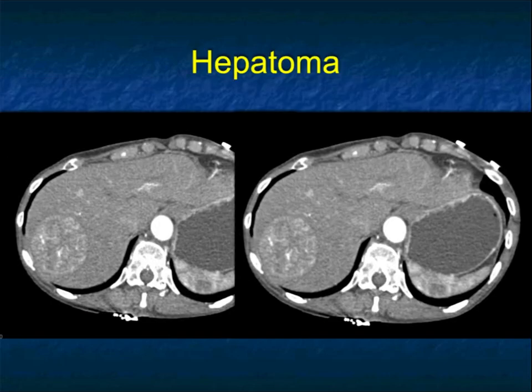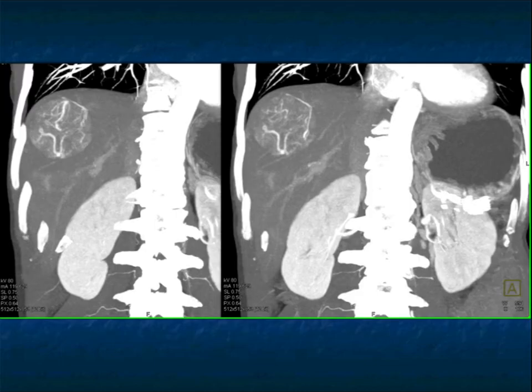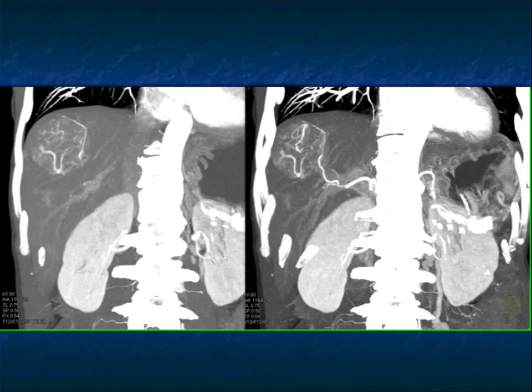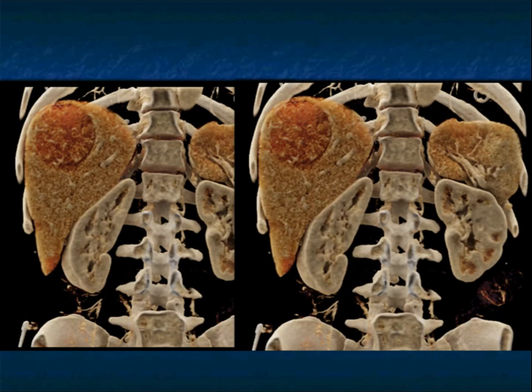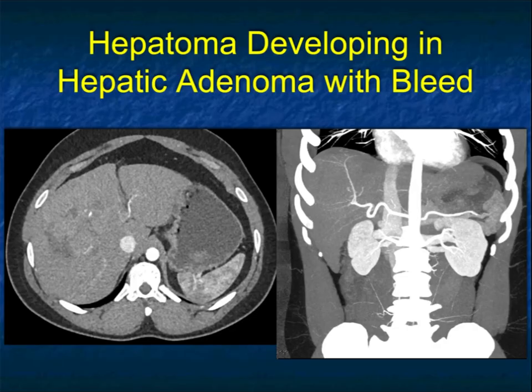Another thing to mention regarding hepatomas is the pseudocapsule. No, you don't need to see an infiltrating tumor. Well-defined mass, hypervascular, neovascularity, really good for hepatocellular carcinoma. So again, pseudocapsule doesn't mean the patient's resectable. It makes it look impressive and well-defined, but a very good appearance for hepatoma. This is really accentuated on cinematic rendering, where it's really nicely shown both on the arterial and venous phase imaging.